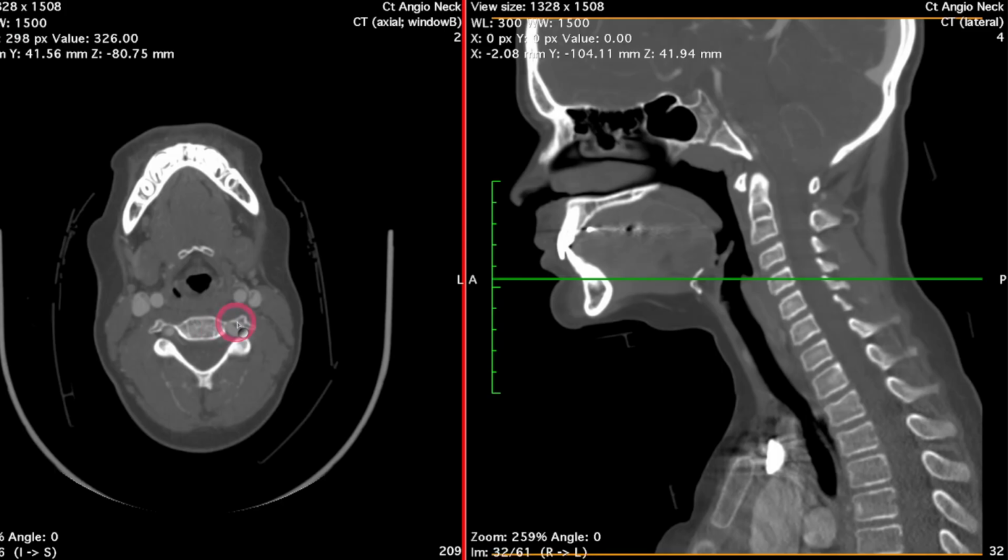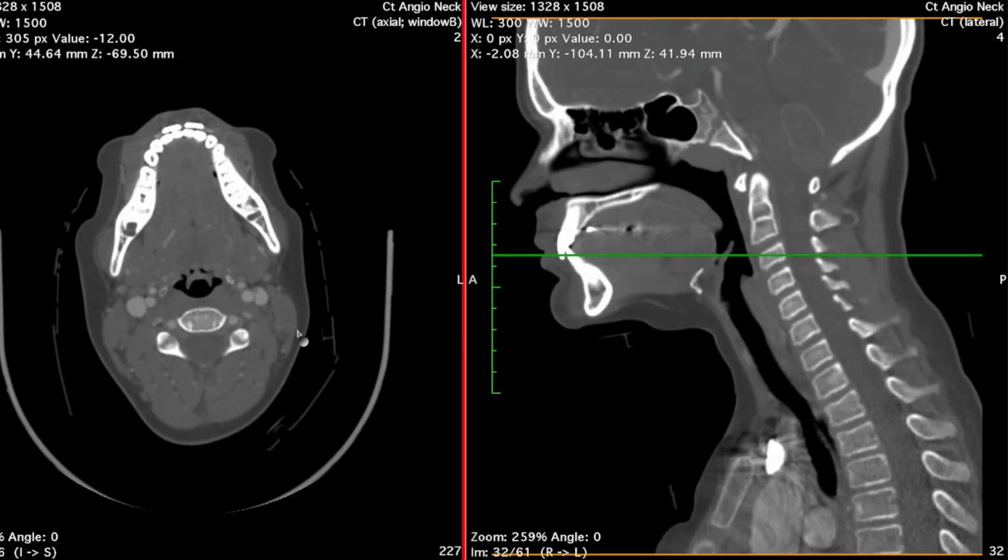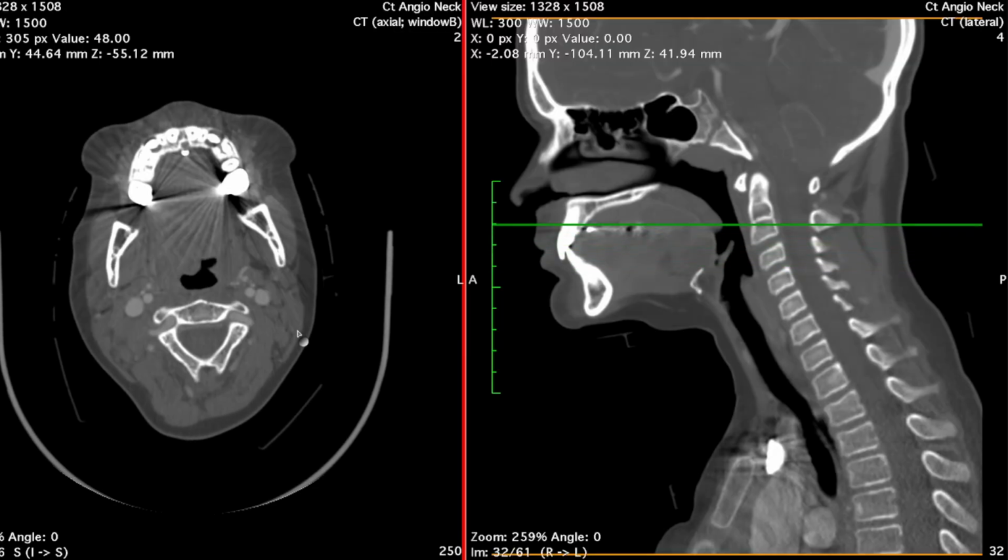All 7 cervical vertebrae have transverse foramen, but the C7 transverse foramen are so small that they don't actually transmit any arteries. So what this means is that vertebral arteries course through C6 to C1 transverse foramen. Some other unique things with cervical vertebra to talk about are C1, also known as the atlas, and C2, known as the axis. So we're at C4 here, and I'll go ahead and scroll up towards C1, which is just below the base of the skull.